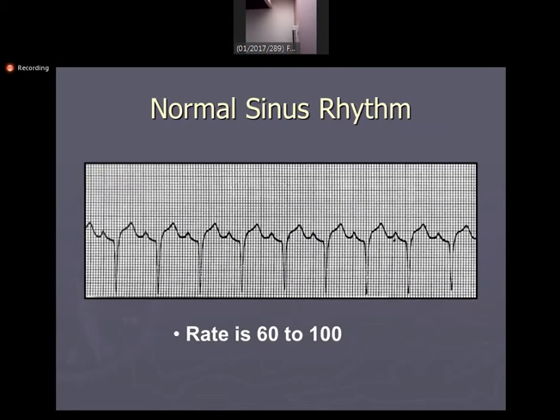So what is sinus rhythm? I'm skimming some difficult slides because we do not have enough time to cover all these things, and we cannot cover all this normal or abnormal ECG in one lecture. I just want to show the basics.